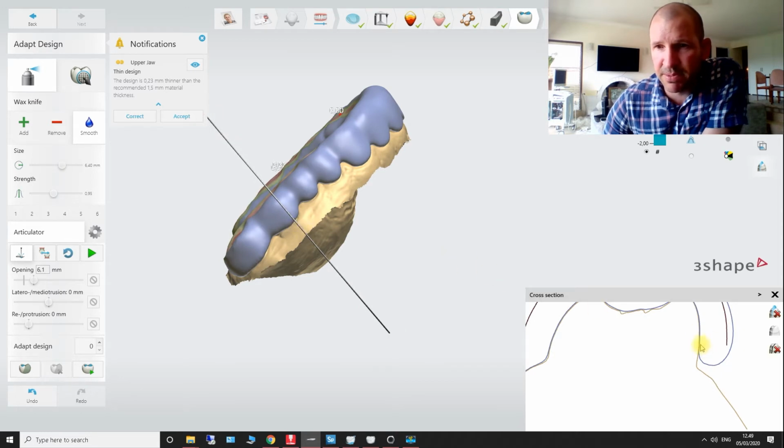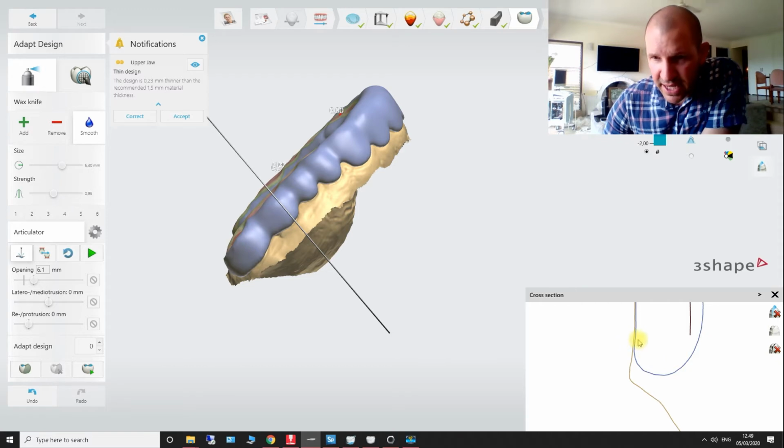So it's engaged, most probably this is the undercut starting about there. And if I made this 2 mil thick, what happens is, this is 1.5, but if this was 2 mil, it wouldn't start to join here. It would start to join about there, and it will come across and go to about there.